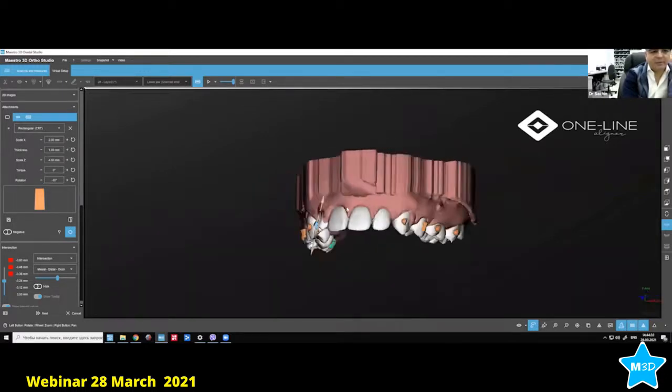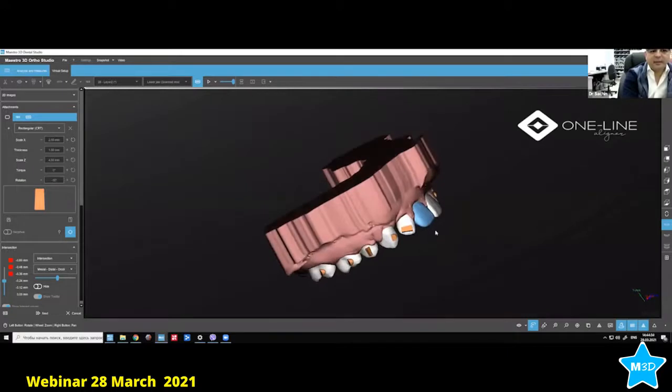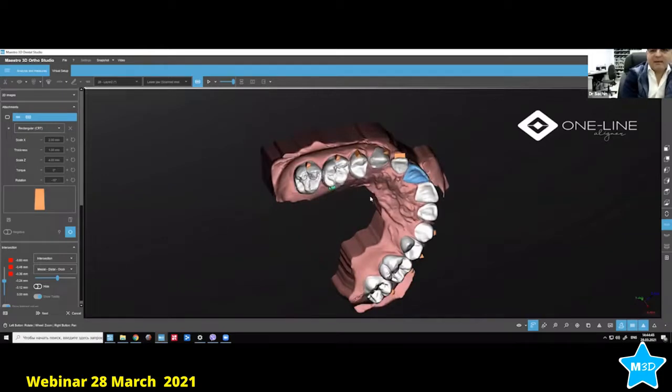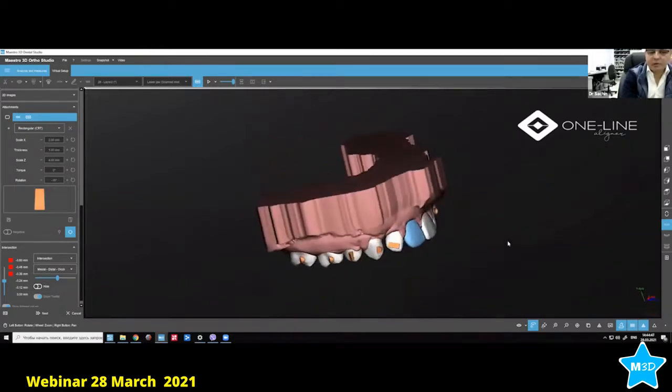Change the rotation, and this is what you can use. The other option for getting a tip. It's a bigger attachment, and you get it like this. You see now? It's a very, very big attachment. This will help you also in the tip.